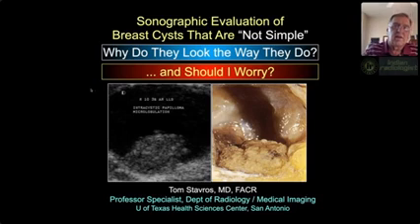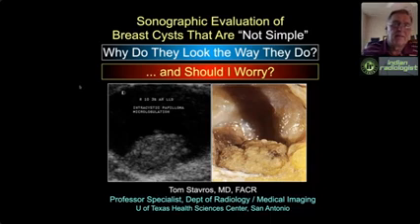So we'll start with the cyst talk. And we're going to talk about breast cysts that aren't simple. People worry about them a lot, but in general, I think they worry too much because the vast majority are benign. So we're going to show a lot of beautiful histology from Laszlo and other places that show why cysts look the way they do and help you get a feeling for whether you should worry about a non-simple cyst or not.